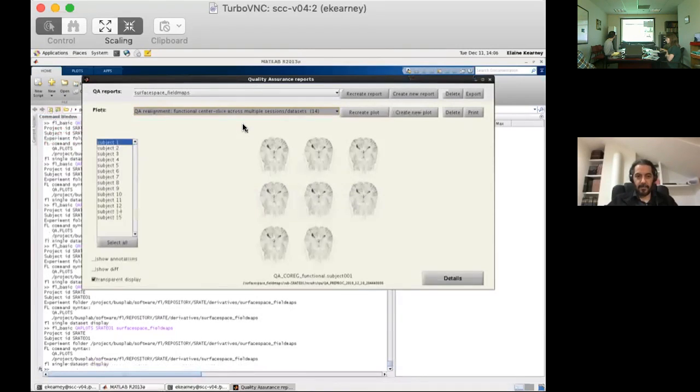So this is the realignment images. Here I was just wondering what exactly we're looking at. The brain just looks a little bit different to how it comes out from the volume base. So is this right?